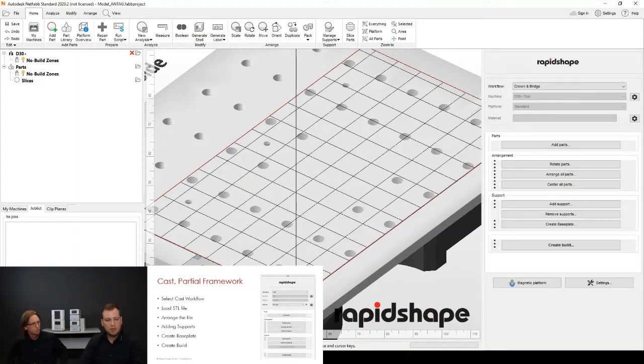This would definitely, but the script that's with the NetFab, if you have the latest engine, should be applicable. The script setup for that is very reliable. Again, if you want to create your own scripts for specific designs, then this is something that we will cover in a future webinar where we will go into further details on how to do all these modifications.